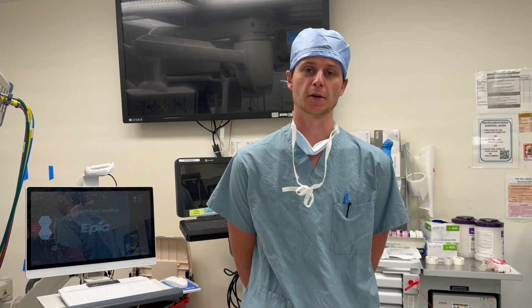Hi, my name is Brad Steinman. I'm one of the anesthesiology residents at University Hospitals Cleveland Medical Center. And today we're going to be discussing an ENT operating room setup.